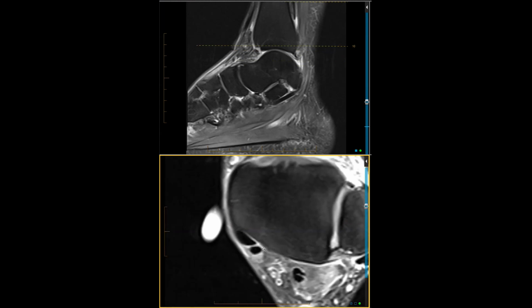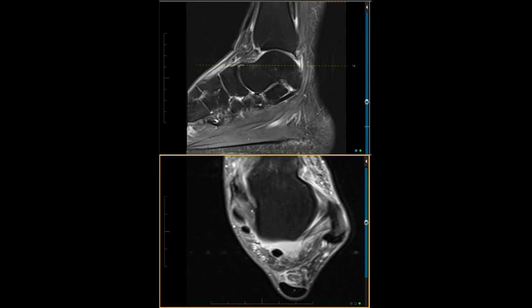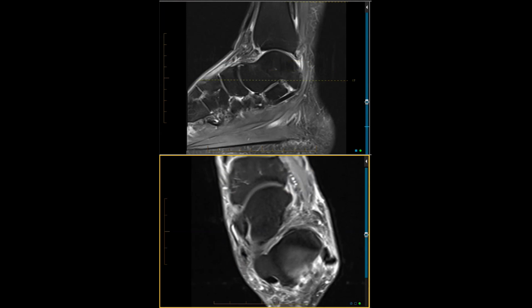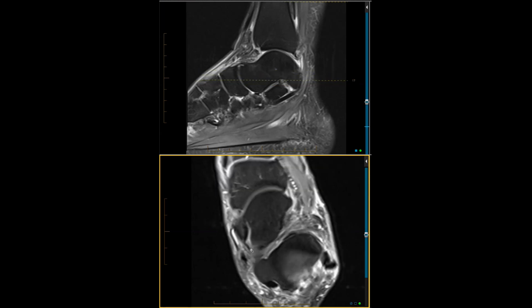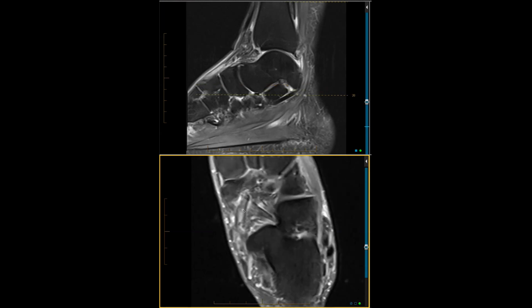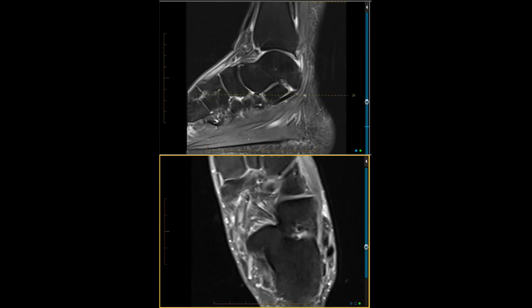Paying attention to our posterior tibial tendon, we're going to take it down, passing the fibers of the deep deltoid, passing the fibers of the superficial deltoid to our location medial to the navicular. Now, once the posterior tibial tendon passes the region of the superomedial band of spring ligament, which is seen partially here, then the tendon's anatomy will split into two main bundles. One bundle will go to attach at the medial navicular. That's about 2/3 of its tendon. And then another third will go down and variably attach to the cuneiforms and metatarsal bases.